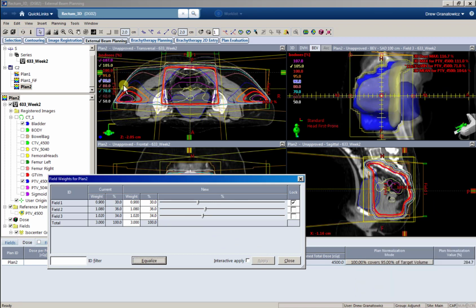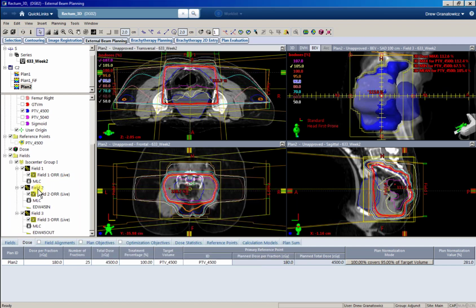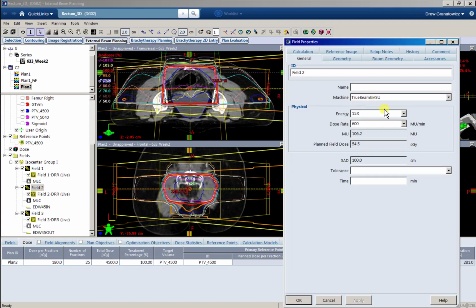Because more dose is coming through those EDWs, so the effect of those EDWs goes up. If we take weight away from those lateral beams, you know, that weight gets shifted back because we're adding more dose from our PA beam. So hopefully that makes sense. But you know, we're pretty close. So 113, that's pretty close. So let's just see what happens when we change these to 60-degree wedges.